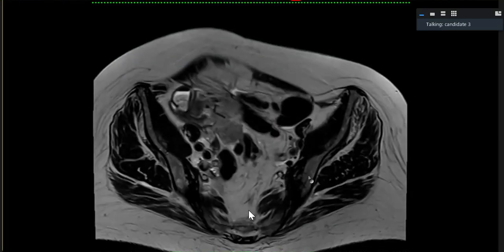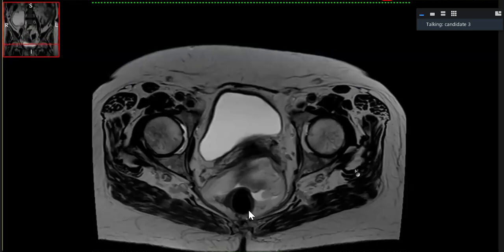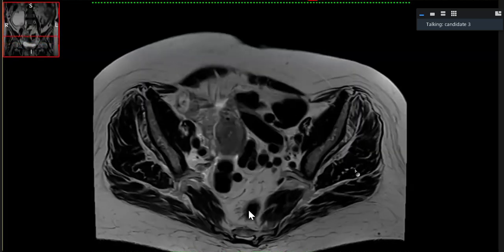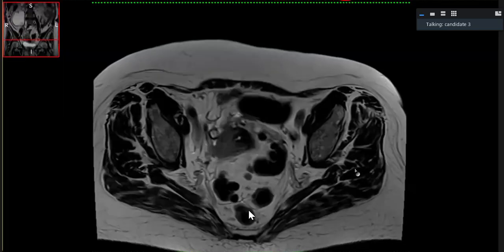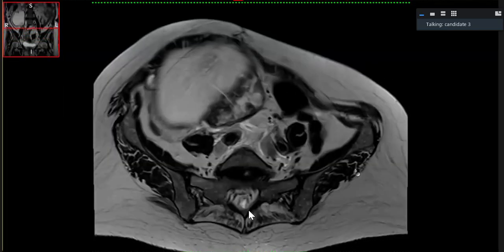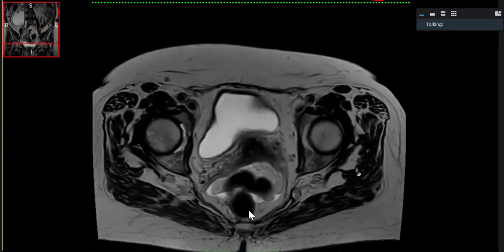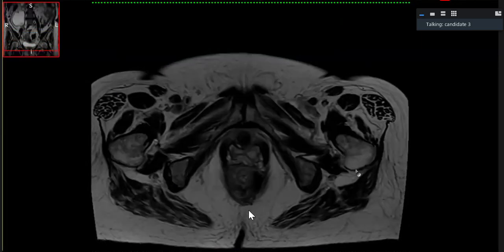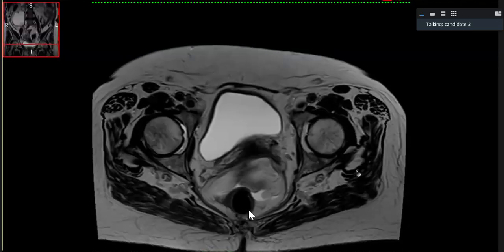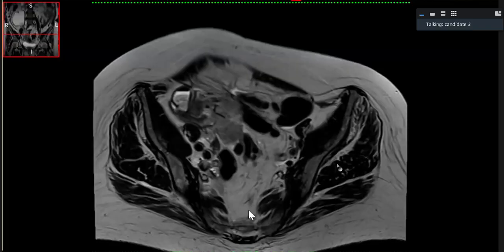Now I want to have a look at the ovaries to make its relationship clear about its origin. Coming to the pelvis, I cannot see the right ovary separately, and there's free fluid in pelvis as well. And I can also see there are some nodular areas along the peritoneal outline of soft tissue signal intensity. I'm concerned about patient's age as uterus is small in size.